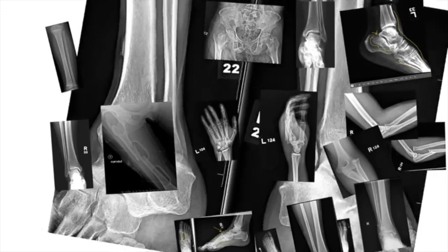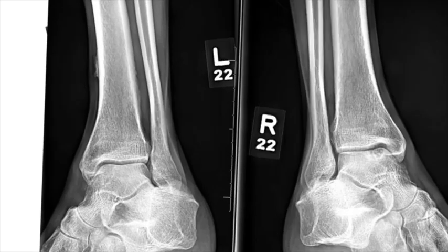The last thing I'm going to show you, let's just take a good close look at the joint space. And you have to follow the smoothness of the cortex, not only along the long bones, but also along the joint space. Here, if you look at this side, you see it's very smooth. The joint space is very homogeneous.